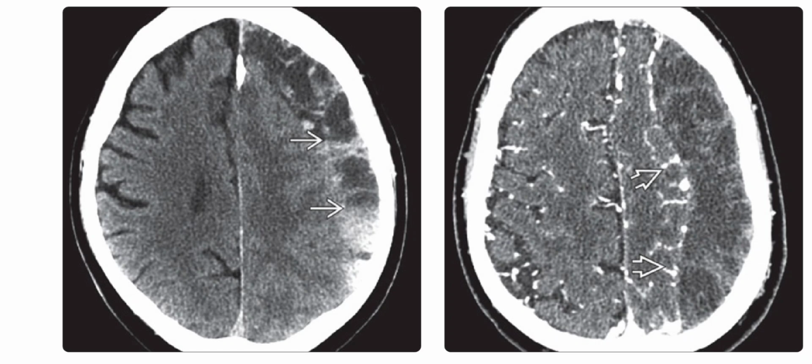Left is the axial non-enhanced CT scan in an elderly patient with multiple falls, and it shows a bubbly fluid collection with loculations and multiple blood fluid levels. Right is the CT angiography image in the same patient, and it shows the bubbly crescentic fluid collection. Also seen is the inward displacement of the brain with compressed sulci and displaced cortical veins.